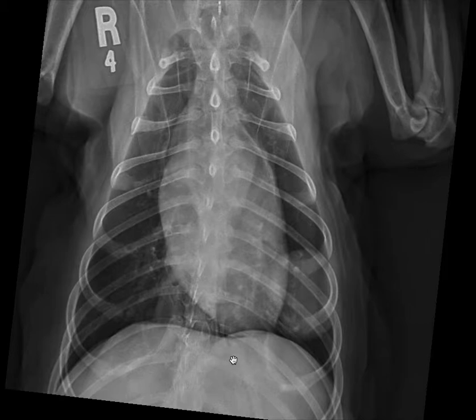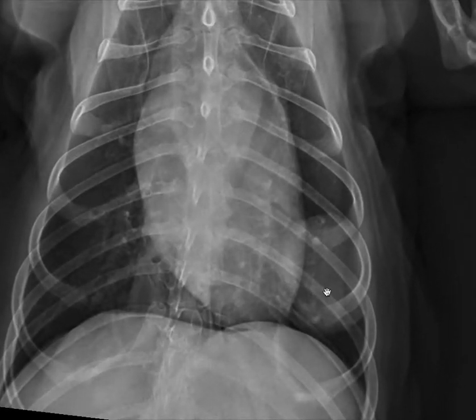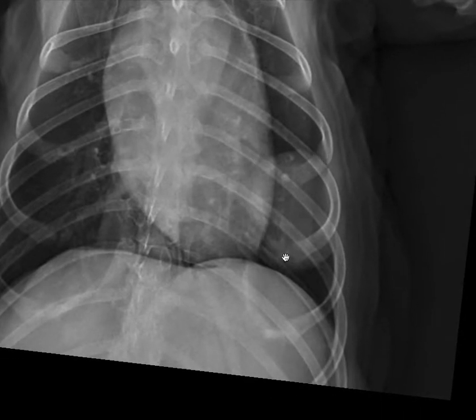So, let's start by looking at the angle with which this soft tissue mass in the left caudal thorax contacts the body wall. I can see that the angle that it reaches here is rather sharp or acute, and the same is true for its caudal margin. This is the classic appearance of a pulmonary mass that contacts the pleural surface. We have seen in another case how this angle will be much broader and look quite different when we have a body wall mass that's displacing the lung.